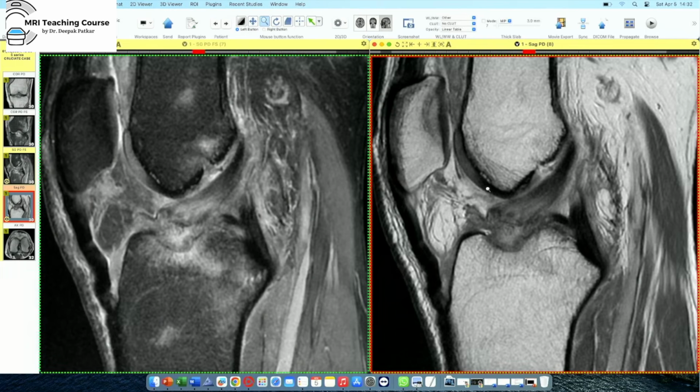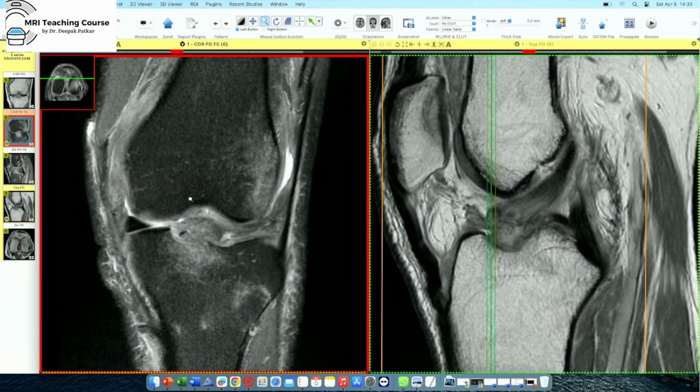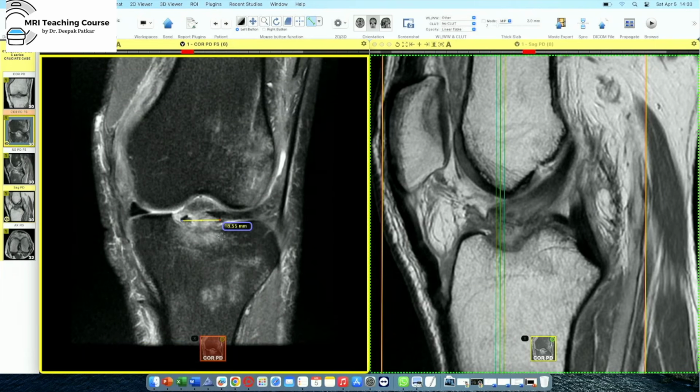So if you see a distal attachment tibial tear and you cannot identify the osseous fragment on an MRI, either look at the radiograph or get a CT. It will most likely be an avulsion fracture rather than just a tear of the ligament. Okay, so here you can see that this is an avulsion fracture. In an avulsion fracture, you need to mention the fragments. So this is fragmented, there is one piece here, one piece here. Either you can give a complete dimension or you can give the dimension of the largest fragment.